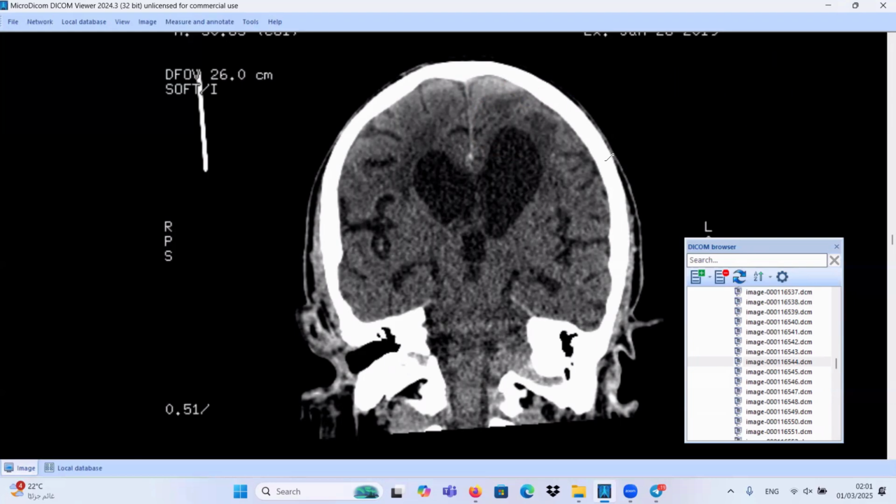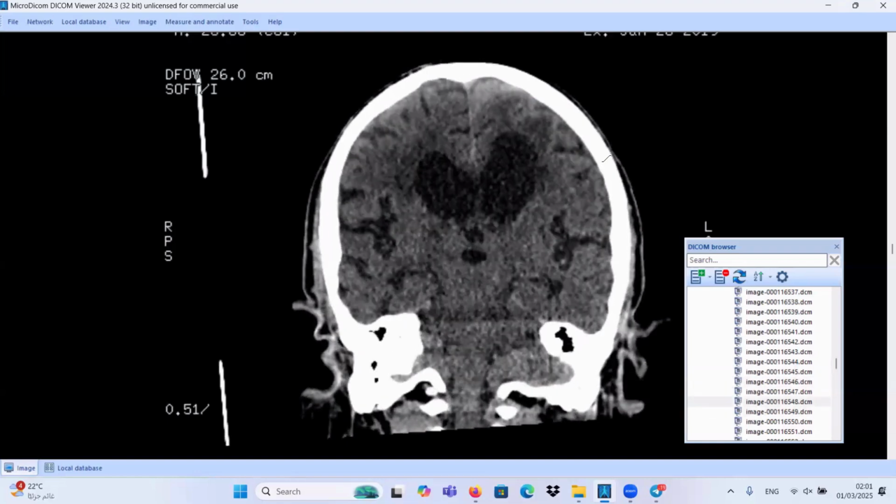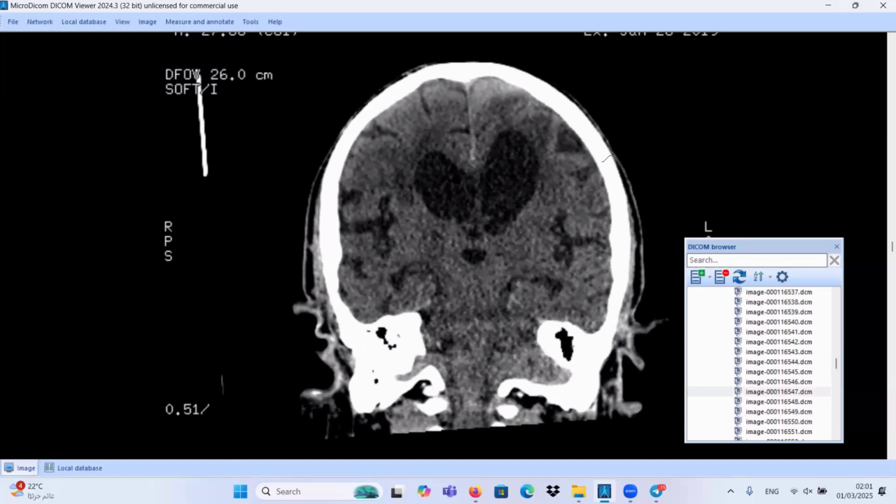As we discussed in many previous videos, we should measure the maximum thickness of the hematoma and comment on its mass effect. I think it is slightly abutting the gyri of the left high parietal region. Otherwise, it doesn't cause significant mass effect. We also have the area of encephalomalacia with a negative mass effect, as we discussed in the axial plane.